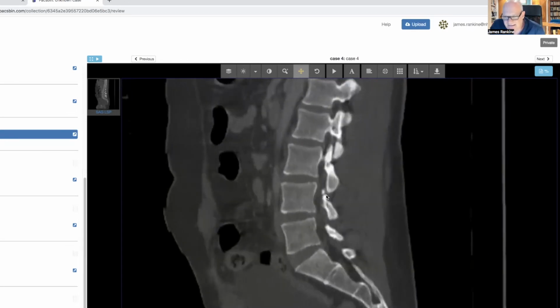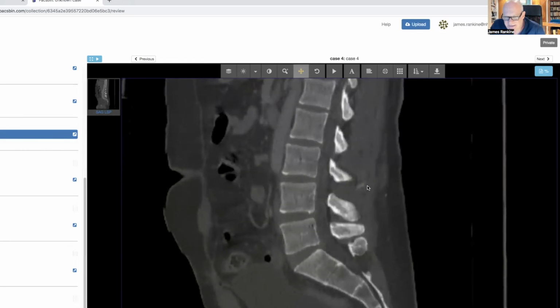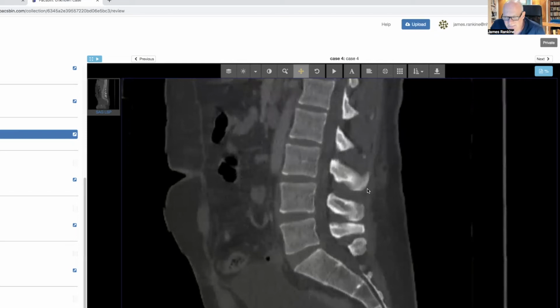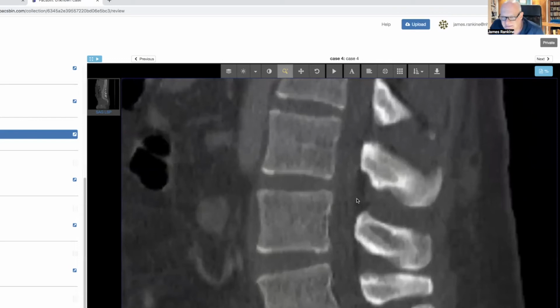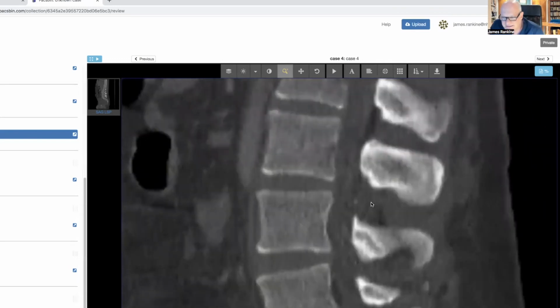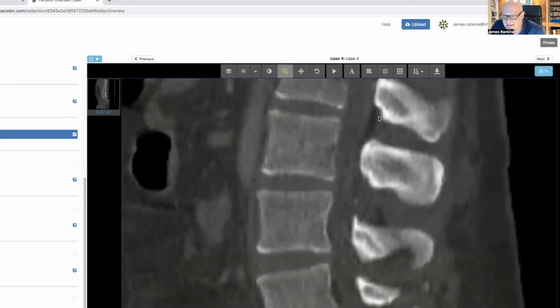It's actually, the cleavage plane will exit through the soft tissues. So in this case, we can predict that the posterior ligamentous structures between L3 and 4 will all be disrupted. And in fact, you can see that on the CT. If you look quite carefully, can you see that this is what we call dirty fat, that we've lost that clear fat plane in there. Look at the level above.